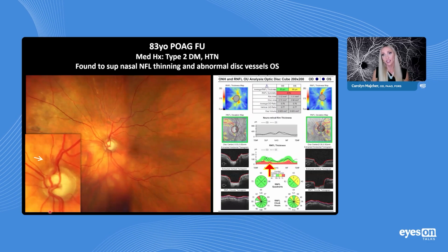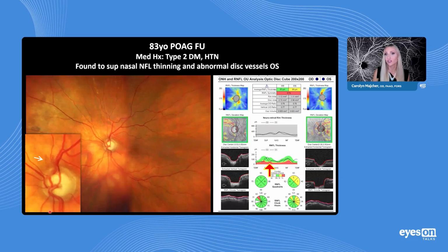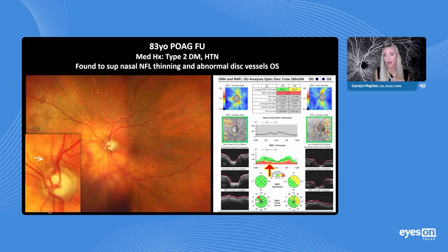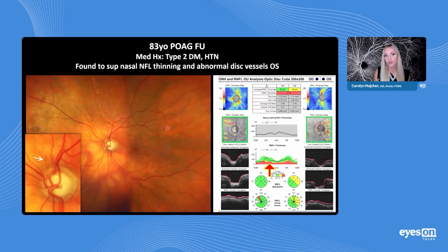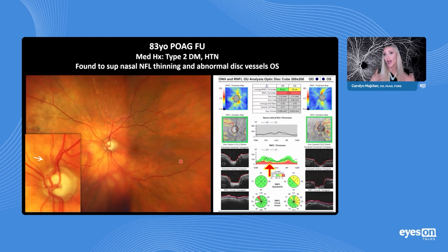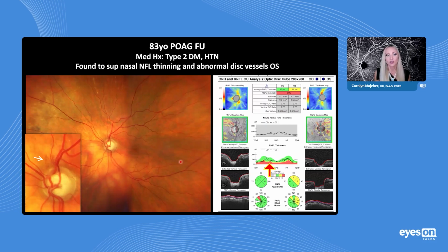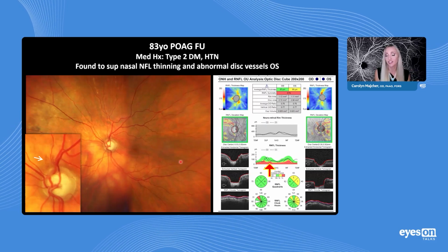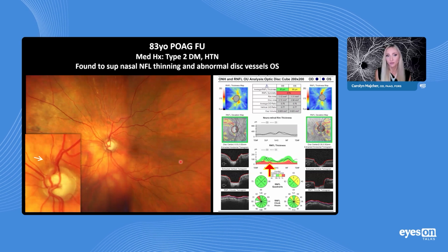And, given that she had type 2 diabetes, my concern is this potentially neovascularization on the disc? Because you can see patients with proliferative diabetic retinopathy that we sort of call like featureless retina that can have just very few or very minimal background diabetic retinopathy findings like dot blot hemorrhages, etc. So I wanted to do my due diligence and make sure that this patient didn't have neo of the disc and proliferative diabetic retinopathy in this particular case.